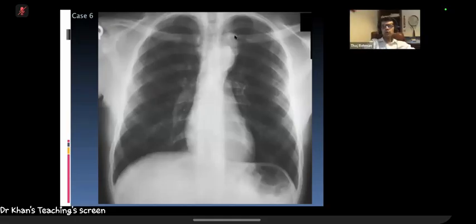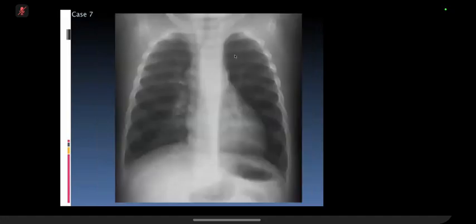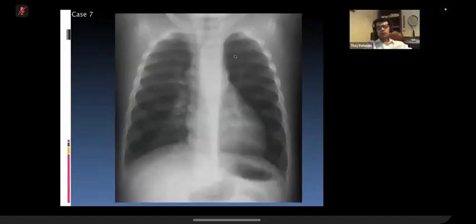That's another thing that you have to look for. If you identify a mediastinal lesion, look for scalloping of the ribs, as you see in this case. And so this is a posterior mediastinal mass. Posterior mediastinal mass lesion, most commonly a neurogenic tumor scalloping the rib.